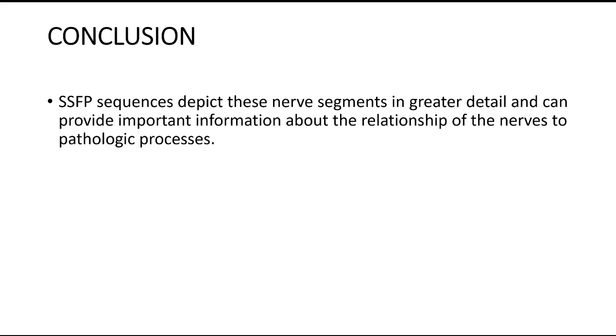So till now we know that these SSFP sequences and the cisternal segments of these nerves are very important, and they can provide you greater information about the relationship of the nerves to their pathological processes.